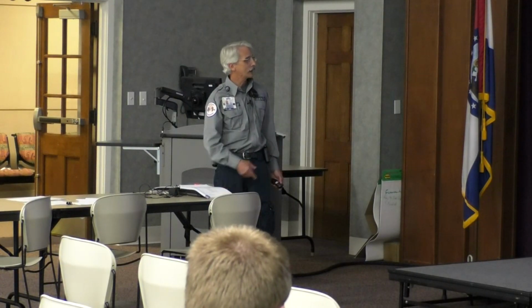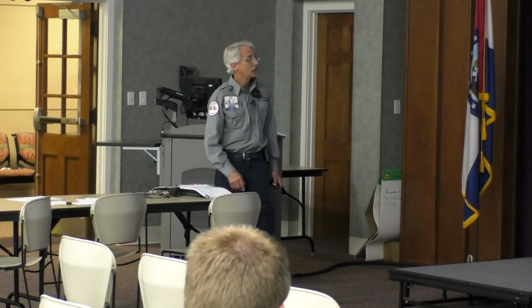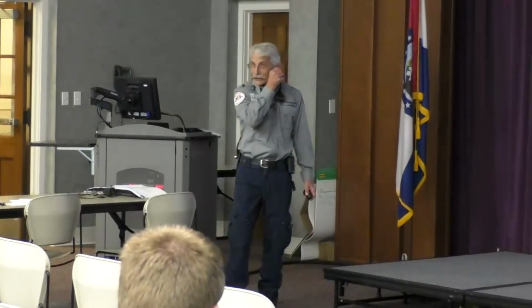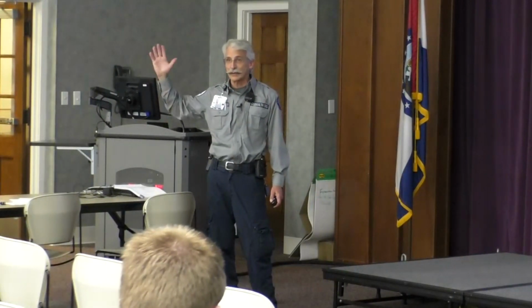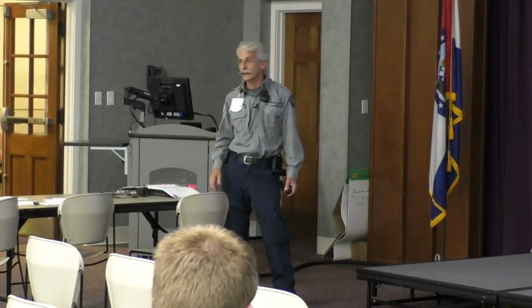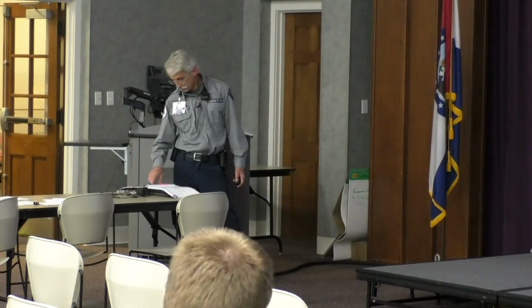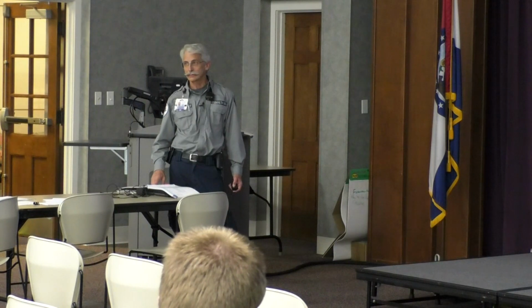Okay. Now, I can come back to here and look at all the answers to all that. The other thing I like about the LifePak 15s is they now start giving you ST elevations out on the right-hand side. That's sweet. That is nice. Don't just believe them, but I haven't found them to be very far off.